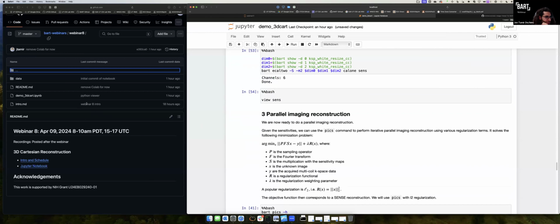Just to clarify, when using the CC command, GCC expects KX, KY, KZ, but if you use SVD, it should be okay. No, in both cases, the command is just expecting K-space, KX, KY, KZ. If you use the GCC command, internally, it will take your data, perform an IFFT in the readout direction, and then apply SCC. If you already give it data that was IFFT'd, you can tell it, hey, don't do the extra IFFT, but it's optional. I can show that in a second if I finish this other question.